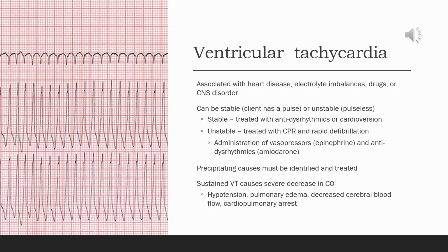In a patient who has unstable VTAC, which means they do not have a pulse present, we're probably running into this patient's room. Looking at the monitor, we see VTAC, we assess the patient, they have no carotid or femoral pulse. Now we have unstable VTAC, and this is a medical emergency. There is really no cardiac output going on. So this calls for immediate defibrillation and CPR.